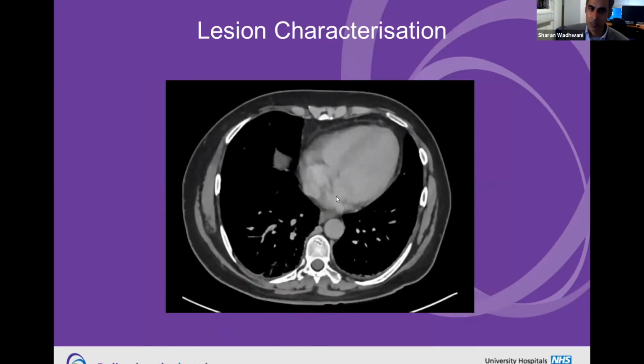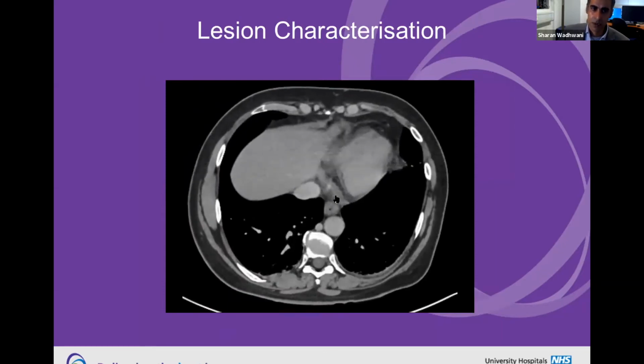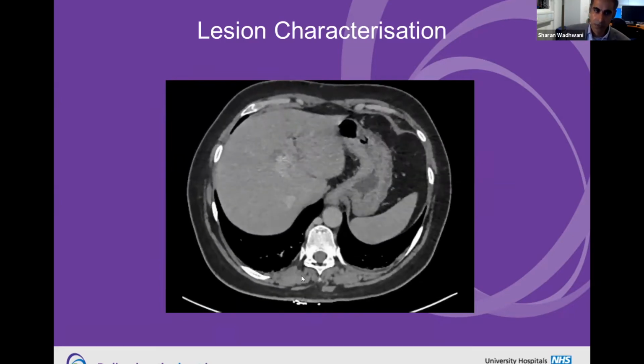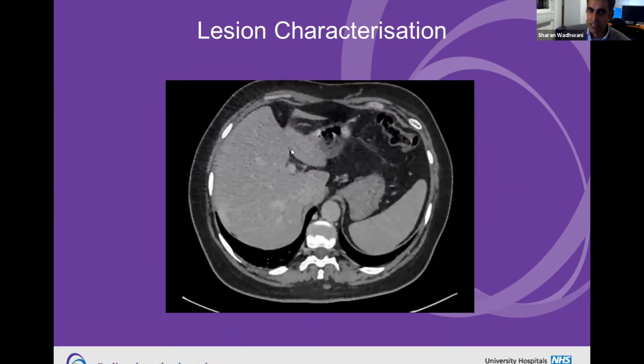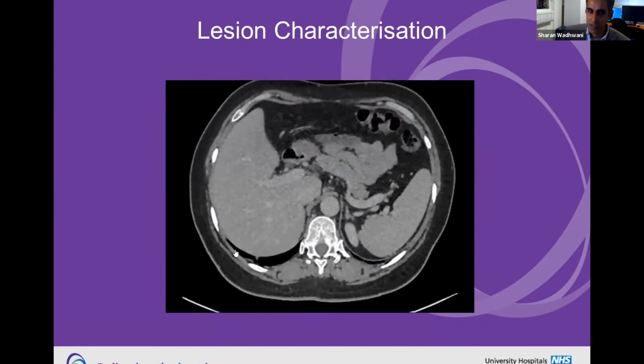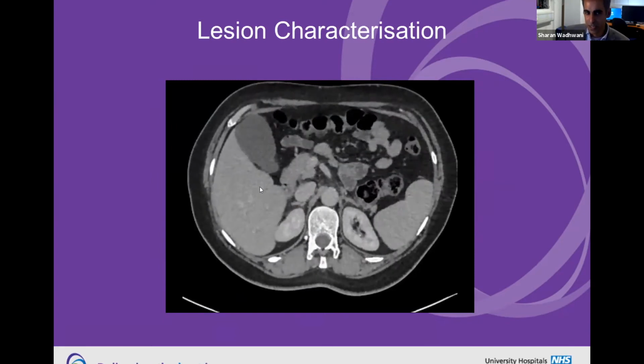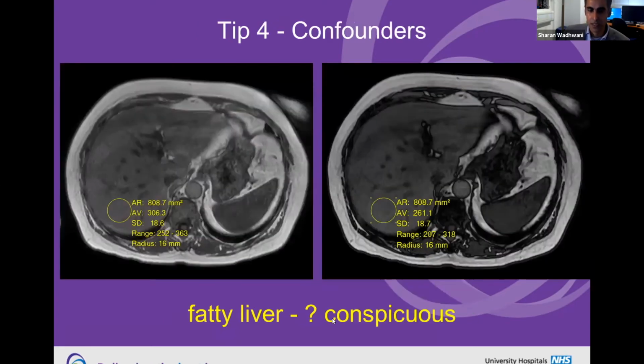Here's a CT, we'll have a look the same way, okay? So looking out for liver lesions, this is your standard portal venous phase. Not easy to see. I think I may have seen something there. There was something maybe there, but it's quite washed out. They're not very easy to see. Okay, and there's not much more. We'll take my word for it there.